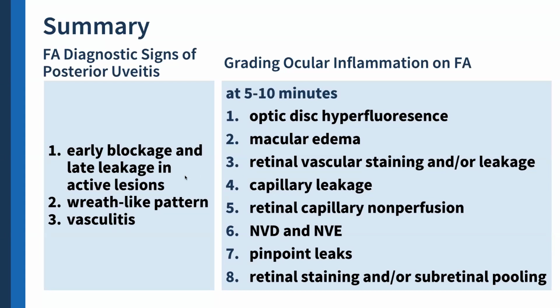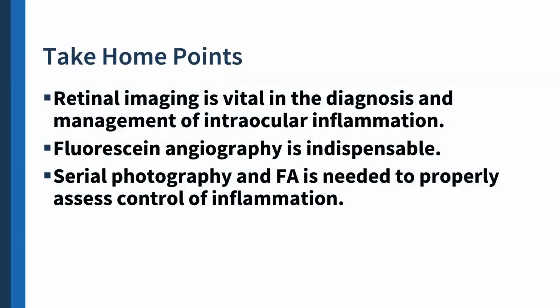And then when you finally determine that it is inflammation, you take a look at the other parameters on the FA: optic disc, macular, retina, capillaries, pinpoint leaks, and retinal staining, for you to be able to determine the level of inflammation in the eye. So in summary, retinal imaging is very vital in the diagnosis and management of ocular inflammation, and arguably the most important test that you should do in these patients.